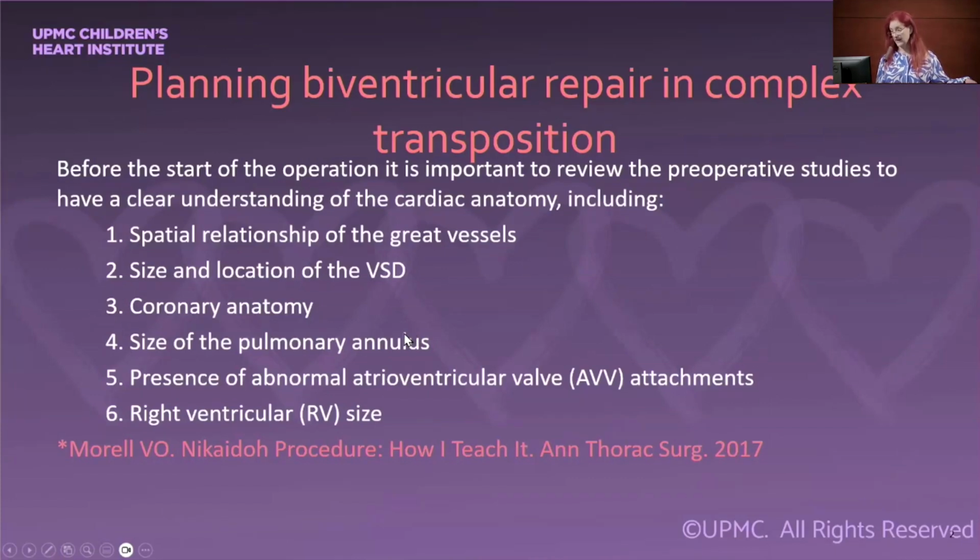If the pulmonary valve is severely hypoplastic, it's unlikely to be amenable to any kind of surgical intervention. However, as an imager, we also look at subpulmonary stenosis, the leaflets, the morphology, the presence of abnormal AV valve attachments, and right ventricular size.